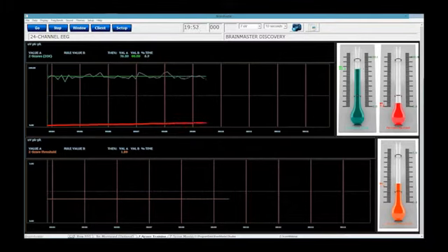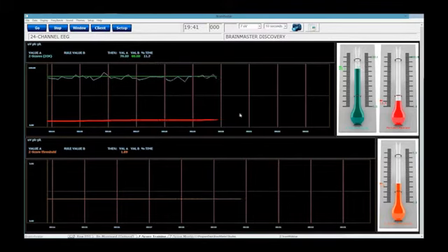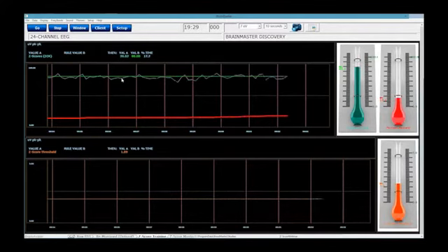And this is what it's going to look like right here. Most people have probably seen this screen. Some of you guys have not seen this screen, but let me explain to you the basics of it. In this top portion right here is where the PZOK training basically is doing its magic. This light blue line going across the screen and going up and down and up and down is the percent of Z-scores that are within a declared threshold range.